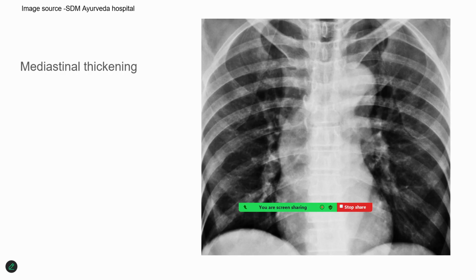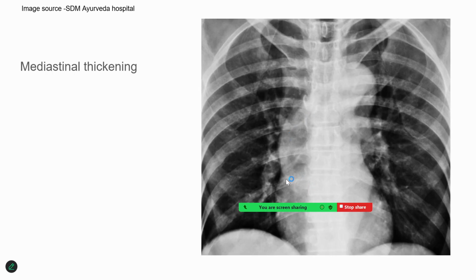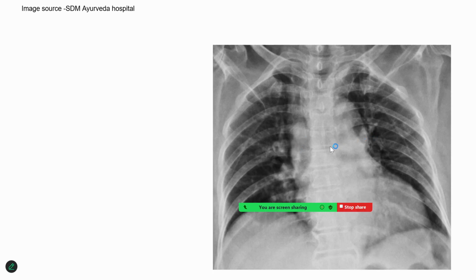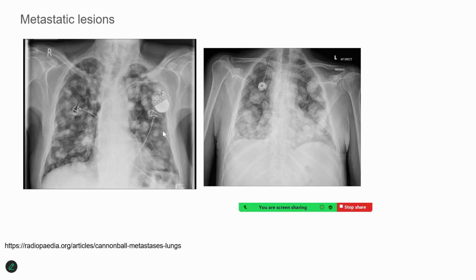But a tumor of the lung can also present with a widened mediastinum. Some examples are tumors of the lungs presenting with mediastinal widening. Either it could be a huge mass with a globular appearance, or flattened, accumulated multiple masses which could be seen in the X-ray, which could also be a sign of tuberculosis. The causes of mediastinal widening can be better made out by a CT scan or MRI, and then the diagnosis would be helpful. Or there could be metastatic lesions.